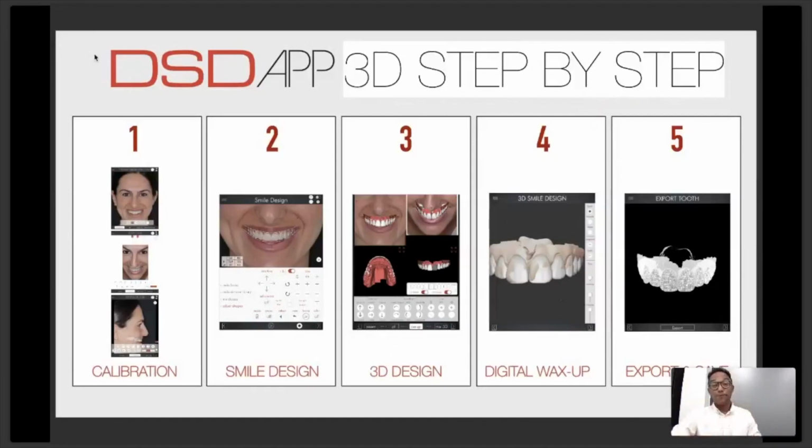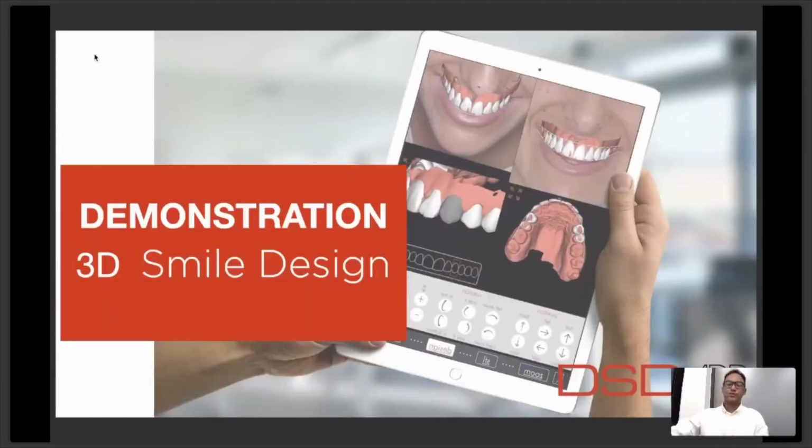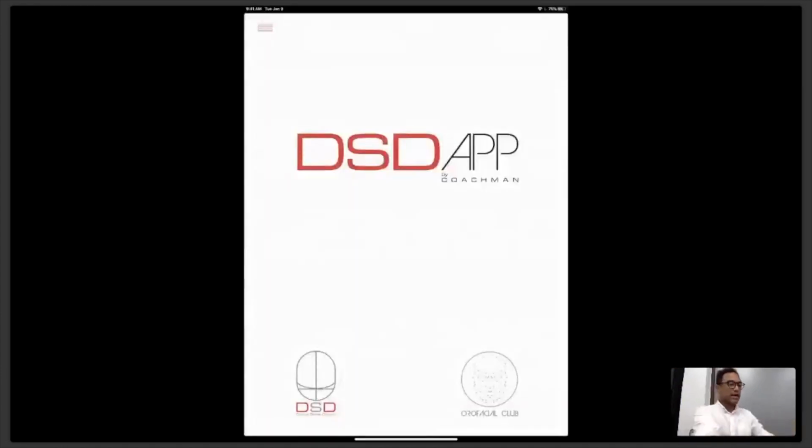All right, so let's continue. I will now do my demonstration with the DSD app. If you have not downloaded the app yet, you can go on your app store and download the DSD app by Coachman, and you'll be able to see everything that I'm showing here right now in your app as well. All right? Okay, so let's get started. I'm getting here my iPad.